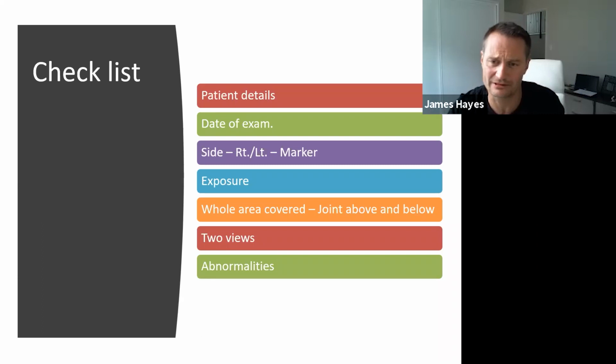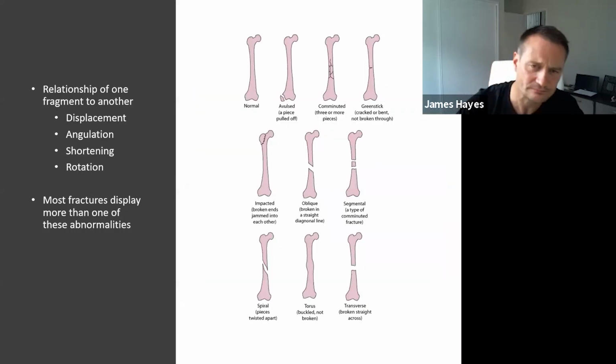The rest of the stuff is kind of up to you there. Check your patient details. They'll be in one of the corners.